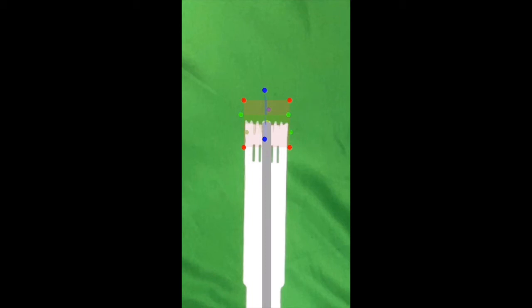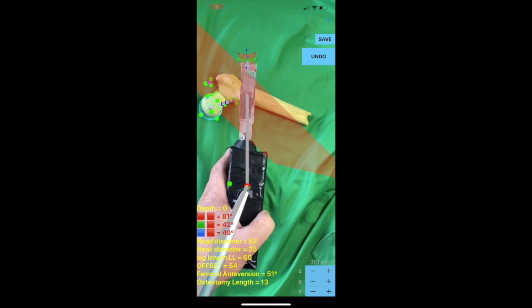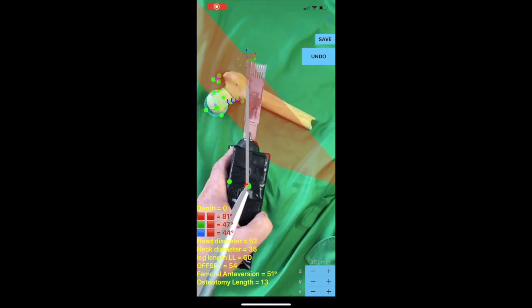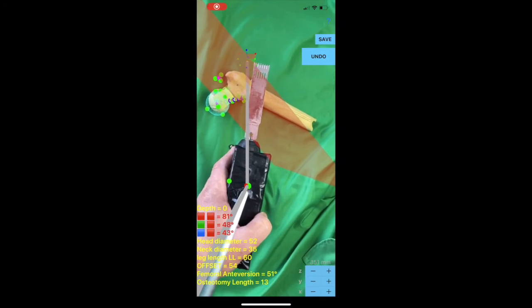The coronal plane, red hazy transparent plane, is depicted passing through two red spheres constantly in augmented reality, which are extending at the edges of the blade. A green transparent plane, transverse plane, passing through the green spheres, perpendicular to the previous transparent red plane, coronal, is depicted in augmented reality. Likewise, a transparent blue plane appears, sagittal plane, passing through two blue spheres, perpendicular to the previous planes.